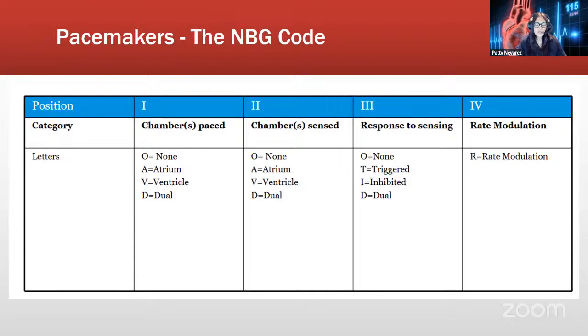I don't know if you've already seen the pacemaker cases, and you can see the reps programming them to respond to certain stimulus. Now, when you read the code, you're going to be able to see what the pacemaker is doing for these patients.